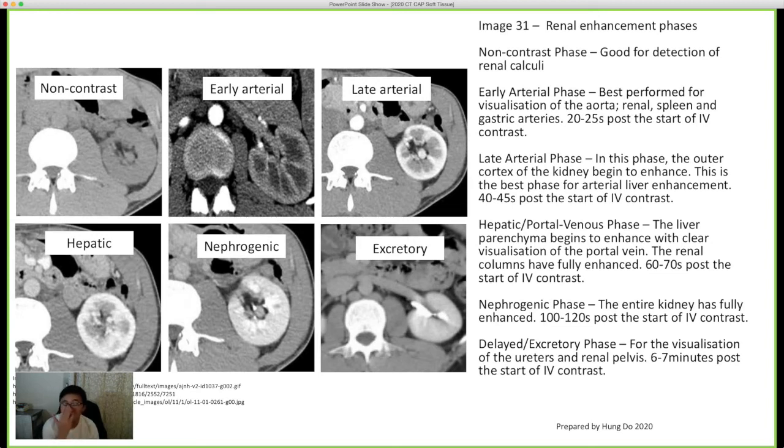Interestingly enough, sometimes, unrelated to this, you might do a barium swallow, and then the radiologist might get the patient prone, and to test for reflux or instability of your gastroesophageal junction, they may put some lead gloves on and actually push on the stomach to try to forcefully push contrast back up. And that will allow them to see if there is any reflux into the esophagus.